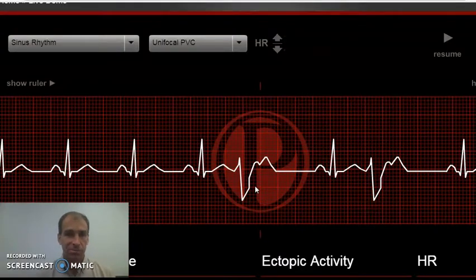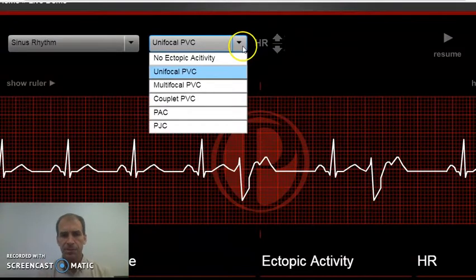Every one of you has these, probably once, twice a day. I have these like once an hour. I'm getting old. They're in and of themselves fairly harmless. There can be issues with these, but for the most part, these happen to all of us. Not uncommon. All right, so that's a PVC.